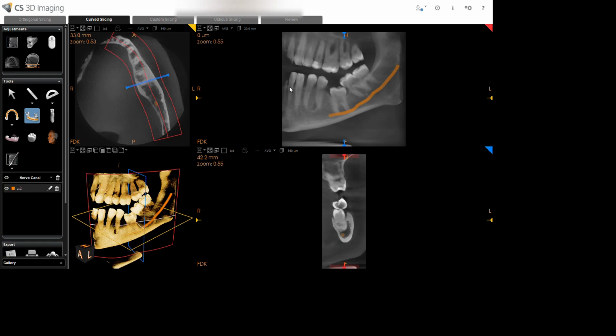Hi everyone. So I'm here to share a case with you. It's a case of a submerged tooth, tooth 36. Now, for many people doing general practice, there are times when we are not much aware of the thing clinically, so we have to go into details by seeing the radiographic view.